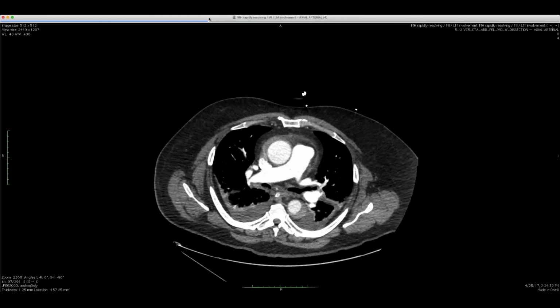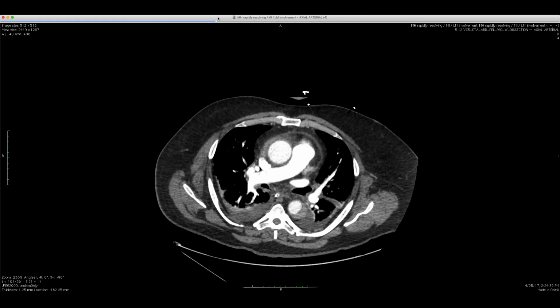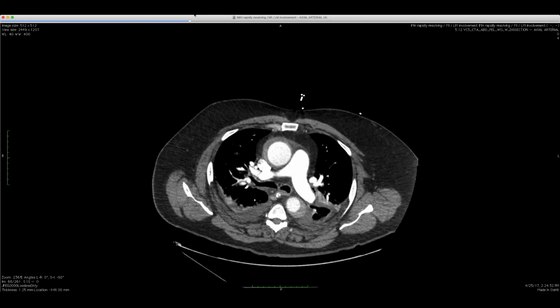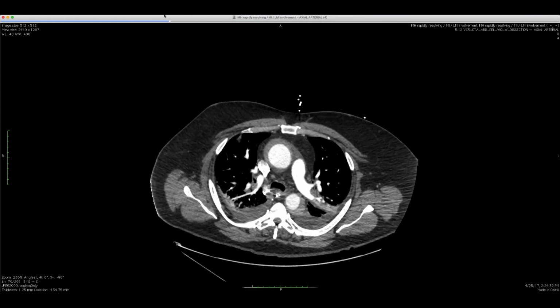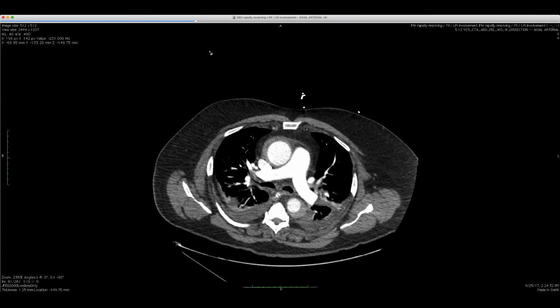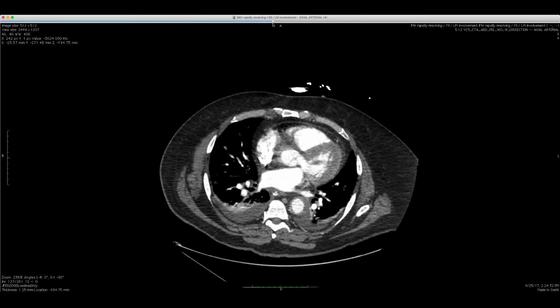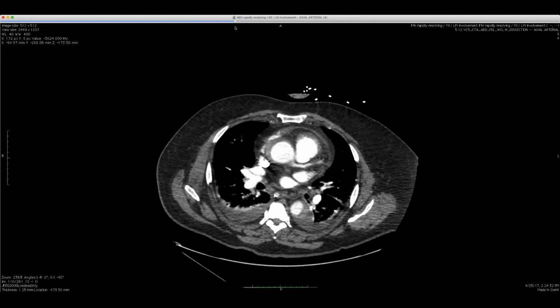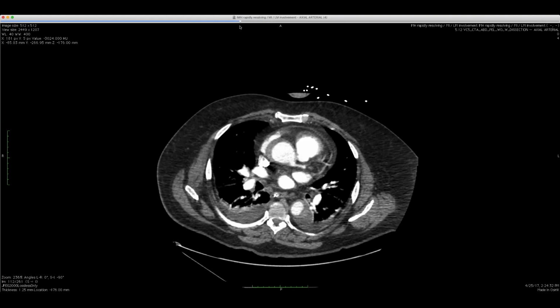Yeah, I think you've massaged some of the blood away that was in the wall. Because this thing is beating all the time, it can massage the stuff away. So I think it just moved around. It's spread out. I'll bet you this person presented with acute chest pain the way a classic aortic dissection would, and I think this is just a forme fruste of dissection. So I'm willing to listen to other ideas.